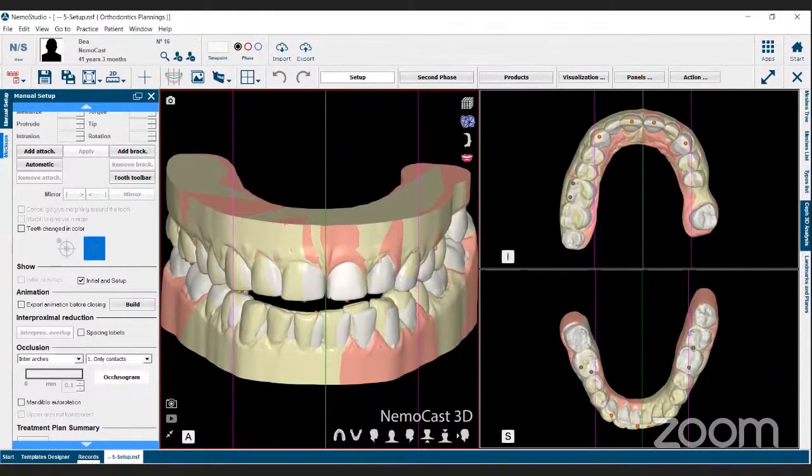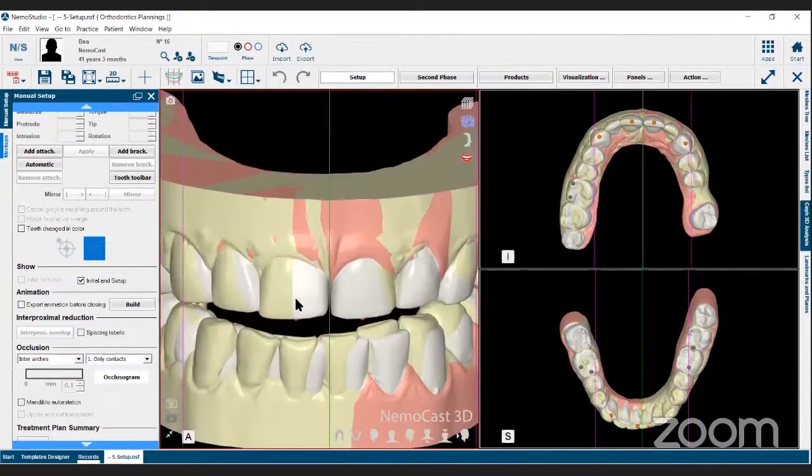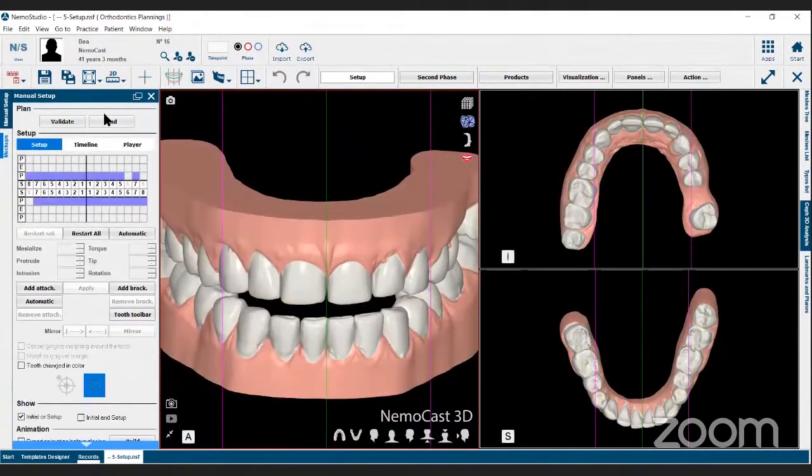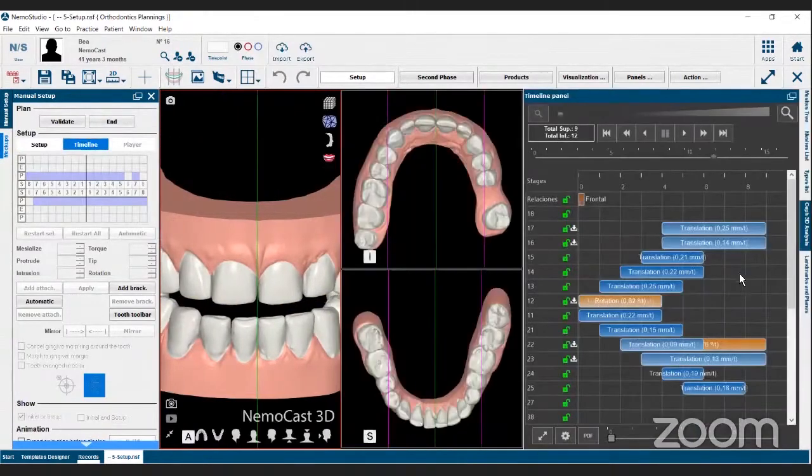In this case, what we can do is add more material to the additive places if we want to create a mock-up that is motivational for our patient. Or if we want to prep the teeth of the patient, we can also create guides that show where we need to prep and how much we need to prep. So for example, in this incisor, we would not need to prep this area, but we would need to prep the other.